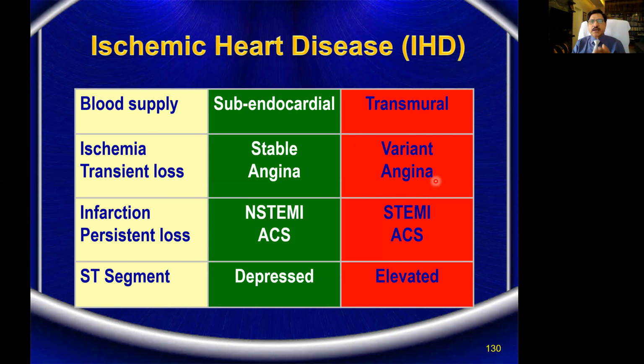Many a time we see a typical infarct-like pattern. The moment he is given the treatment, particularly for transient angina, the variant angina, his ECG becomes normal, which means it doesn't require an intervention with the coronary care unit. So that is a transient angina. I'll show you the ECG of a transient angina. It looks like infarction only, but the ECG returns to normal within a few minutes.